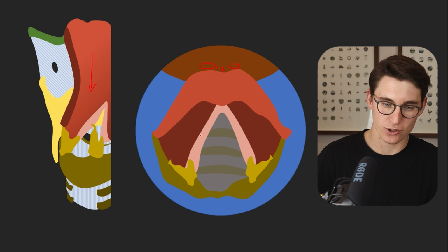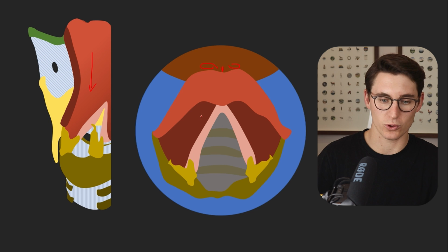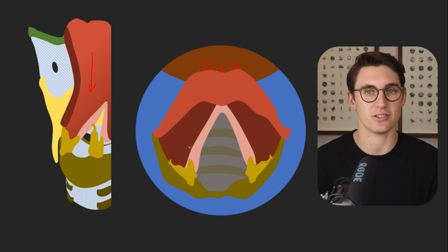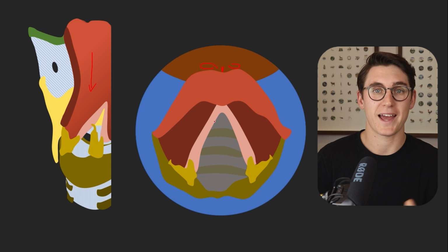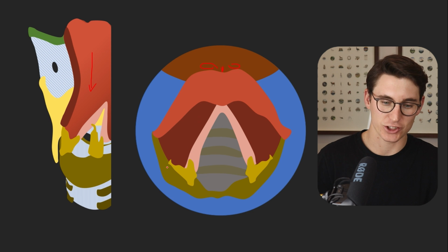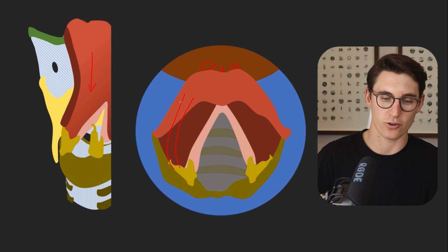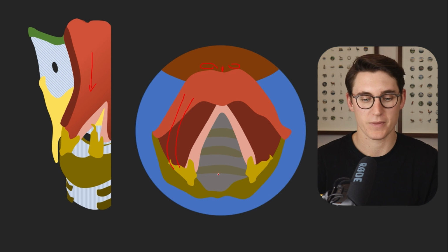We can see this tissue here, which is our false vocal cords, and in between this dark false vocal cords and this light true vocal cords will be our laryngeal ventricles. What I haven't drawn here is the connection between the superior process of our arytenoids and our epiglottis like this, which is our aryepiglottic fold coming across like that.